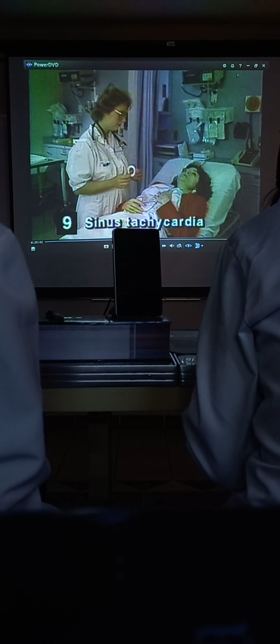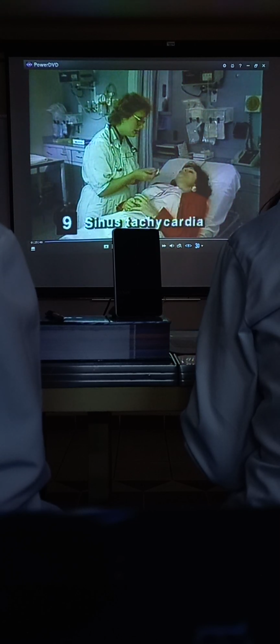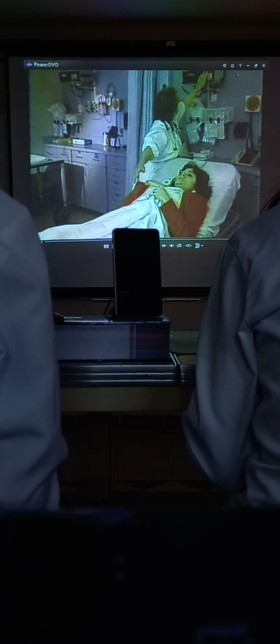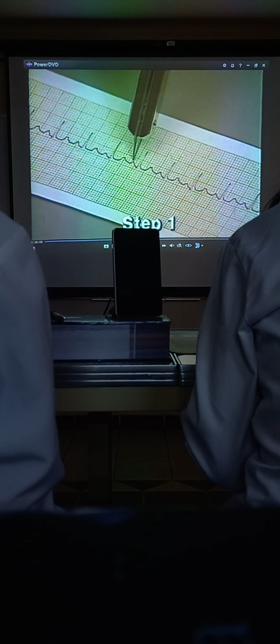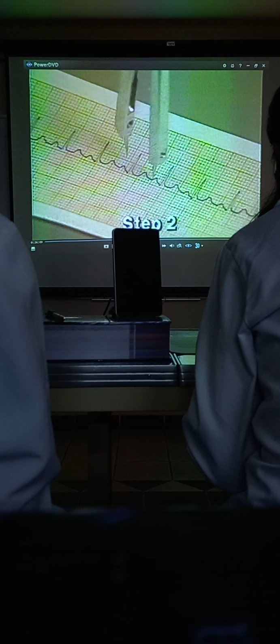The last patient is a female, age 28, who came to the ED complaining of heart palpitations and dizziness. During the assessment interview, the nurse learned that she has recently changed jobs and that her new job responsibilities are causing a great deal of anxiety and other stress symptoms. An EKG monitor strip is recorded using lead 2. The P wave is present. The atrial rhythm is regular.